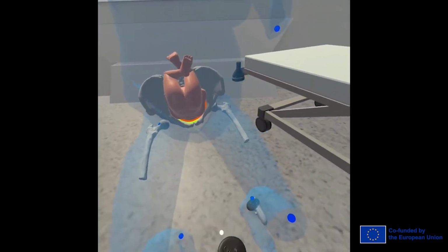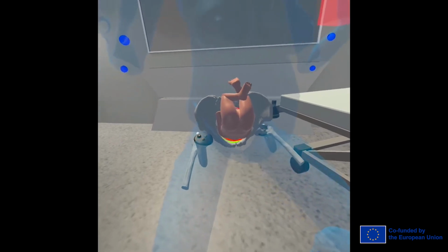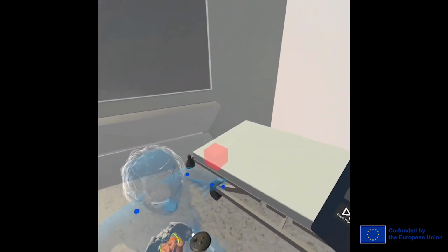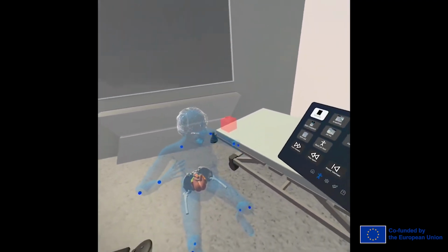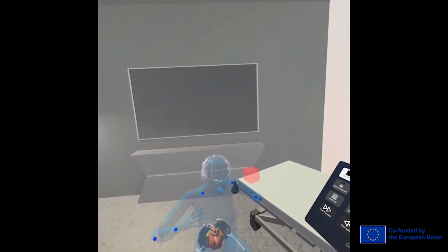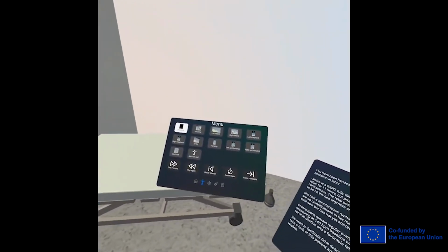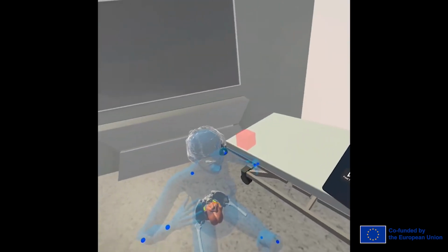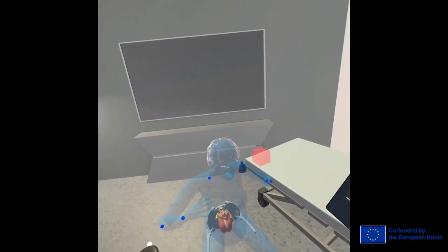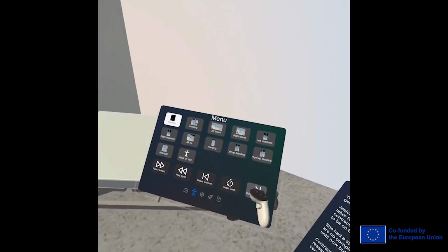You see that now I think I am in correct position, but I don't hear the beeping sound telling me that this is correct. But you can see that the student actually is doing what was intended, and that the student is thinking about it correctly. Now, for these cases, we have a button force complete, which then recognizes this position as correct. So if you see something like this happening, you just tell the student to press force complete.